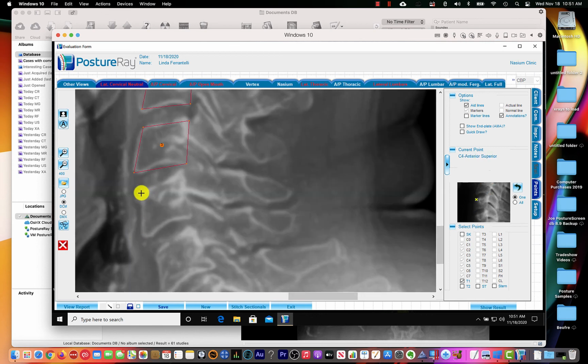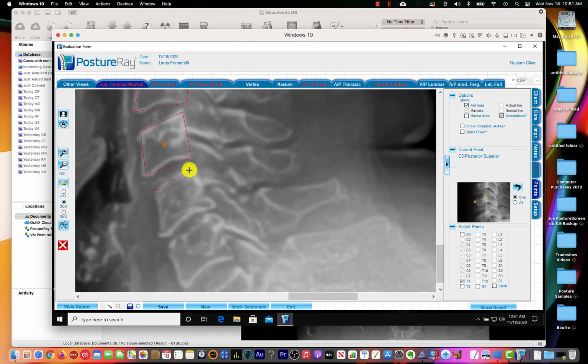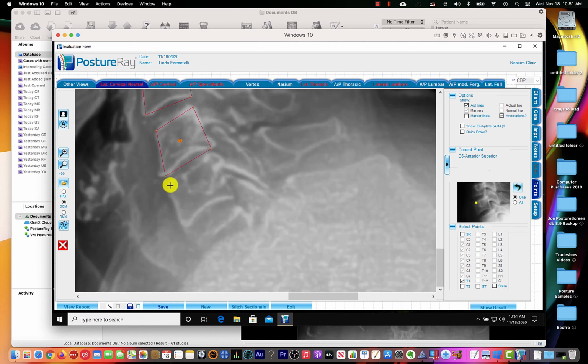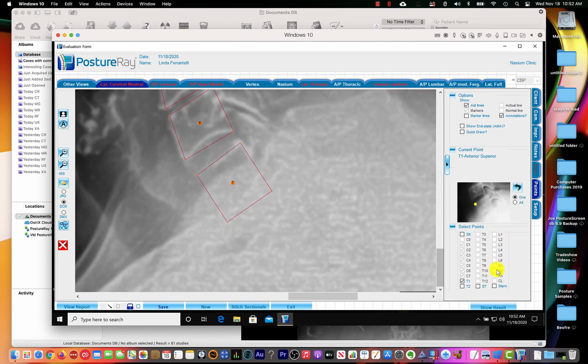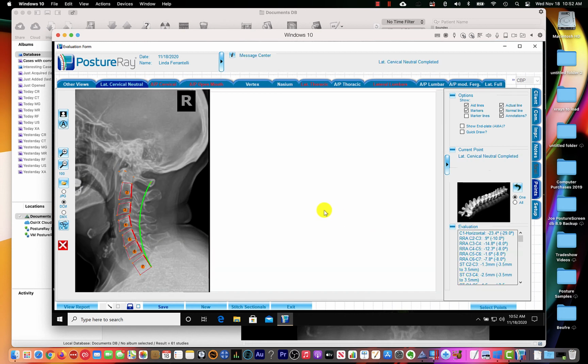This was my mother. She was involved in a car crash, unfortunately. And as you can tell, she's elderly. Fortunately, she had a good neck curve going into it, even though she has thoracic hyperkyphosis. Okay. And I really can't see below that, so I'm going to uncheck T1. Okay. And that's how to send over x-rays start to finish.